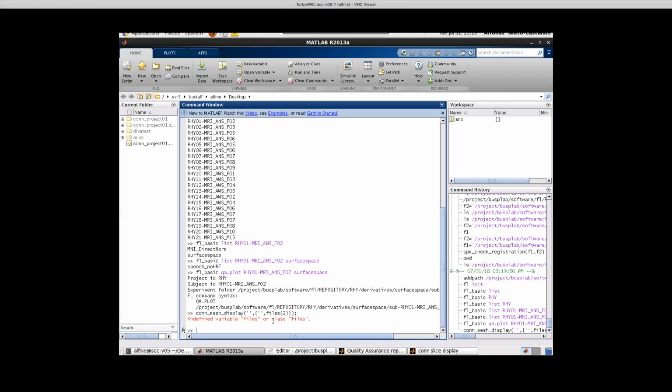Or than actually looking at the three-dimensional surface, which can hide a lot of the anatomy. I see. No, I guess forget the three-dimensional part here. Let's just go back to two-dimensional surfaces. So like LH dot white, the individual subject's LH dot white, right? The speech minus baseline contrast mapped to that, with the surface curvature applied to LH dot white. And I would say that LH dot white's not the best. I would like that LH dot semi-inflated or inflated surf that you generate would be.